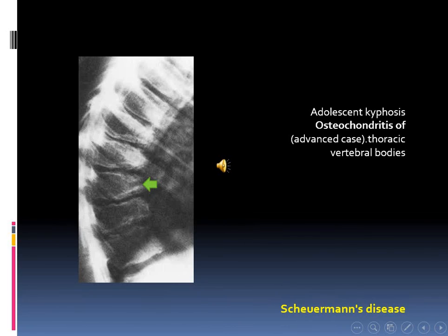Avascular necrosis also can affect the vertebral body. As you can see in these multiple thoracic vertebral bodies, there is abnormal shape because there is no rectangular shape of the vertebra. Instead, there is anterior wedging, meaning an anterior triangular shape of the vertebra. This occurs because of the same process, osteonecrosis. There is devascularization in this part of the epiphysis resulting in abnormal compression, and if this continues, it may result in deformity of the thoracic spine and kyphosis.